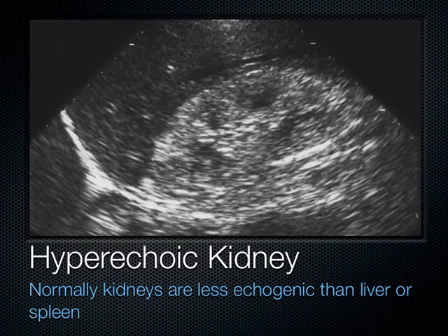Now moving on to the abdomen, there's lots of ways we can diagnose infection in the abdomen. I'm going to start here with the genitourinary system, and we're going to talk about the kidney. Now, pyelonephritis, this is the kidney here. You're used to seeing it much less echogenic, but this is what a kidney looks like when it's infected or has pyelonephritis, which is normally a very clinical diagnosis. You know, you pound on the patient's back, they've got some CVA tenderness, pyelonephritis is diagnosed with that and an infected urine specimen. But here we see a kidney on ultrasound that looks very hyperechoic, and we see this commonly.